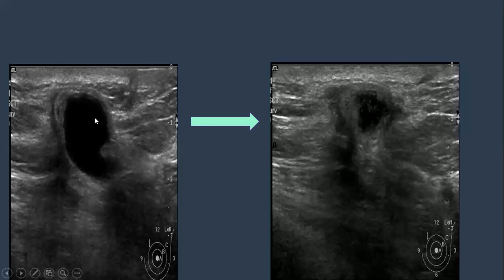This one is immediate. This is post chemotherapy, post radiation, and this is the follow up. So this is the baseline post treatment. Inflammatory mastitis, post radiation mastitis. But what is the inflammation giving you? Lucency on mammography and hyperechogenicity on ultrasound, and giving calcification simulating cancer, and the calcification will grow by time.